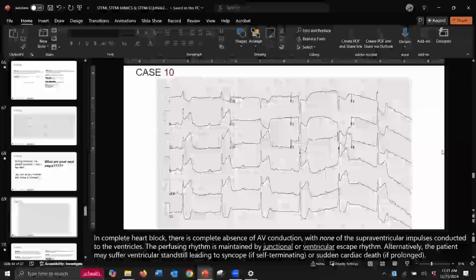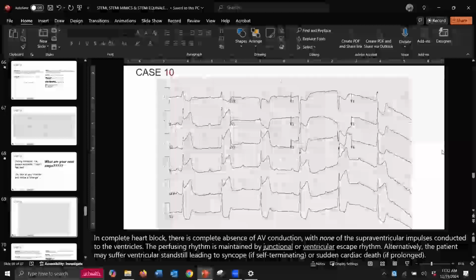And while you're determining this, her blood pressure goes to 50/20. It doesn't make any difference if it's complete or incomplete or partially complete. You've got to do something here, right? What are you going to do? Pads and some new pants.